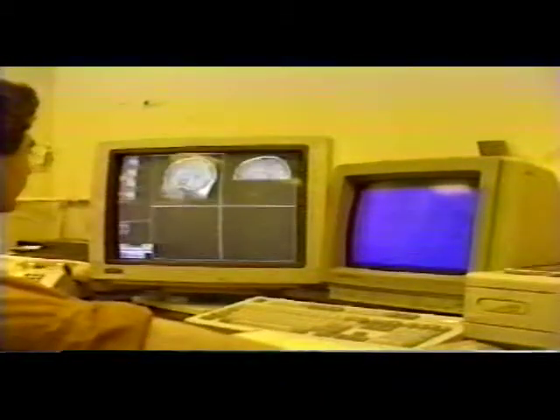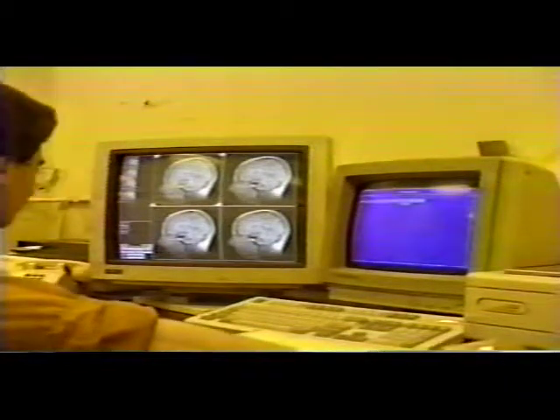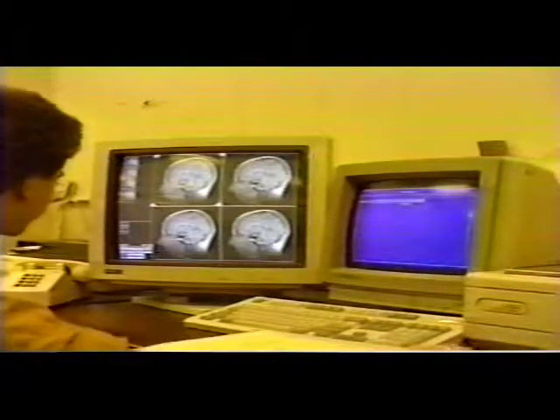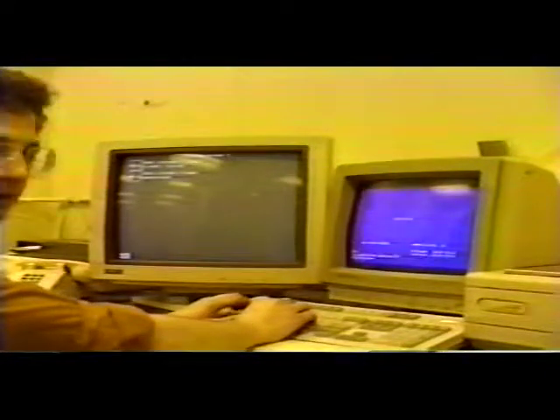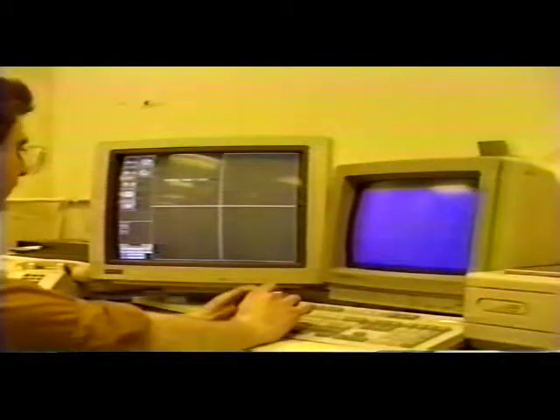There are some other features. Notice it didn't work, and that's intentional. We want doctors to be able to use this by either mouse or keyboard. The mouse might be broken, or the keyboard. Hit a button and get the image directory. Hit another, and get that deeper directory. Typing an image number or a study number at any time will pull up that image or that study.